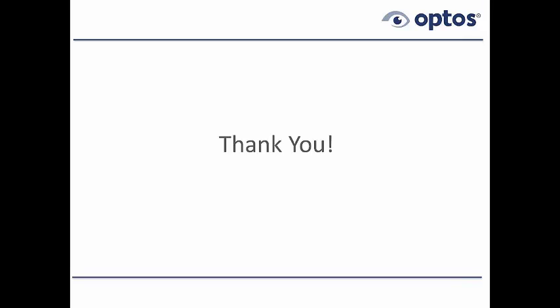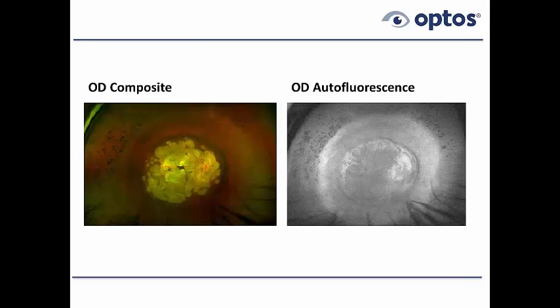In the final case that you just showed, why did that disc appear light in color? Okay, well, this is the high myope, and that's actually a good question. The disc is over here, and it's slightly light, but nothing looks very dark. Even the vessels don't really look that dark here, but the disc does look slightly light. I don't know. It's probably stretched all the way backwards, but I can't say for certain. But you're right, this is sort of uniformly slightly bright. Again, the contrast of the image isn't that good.